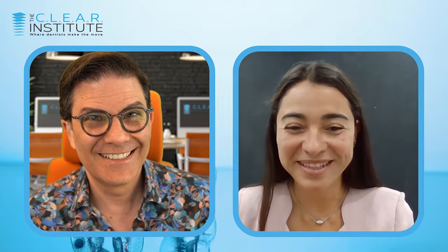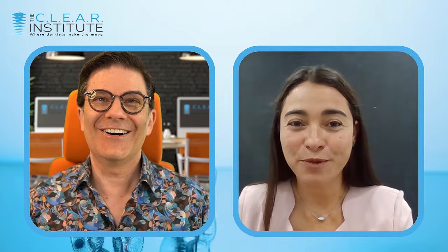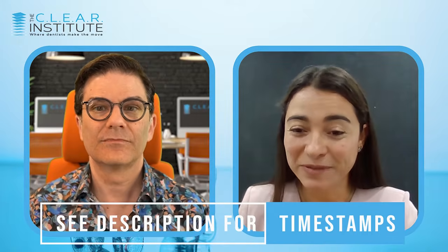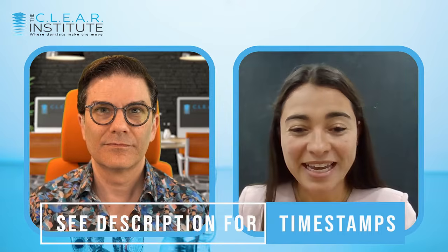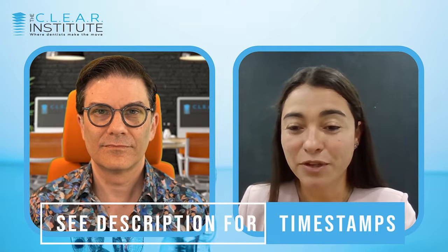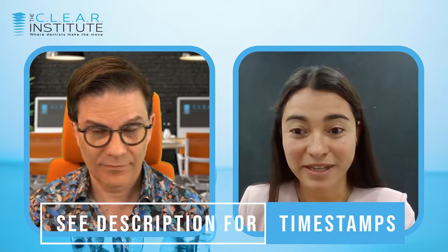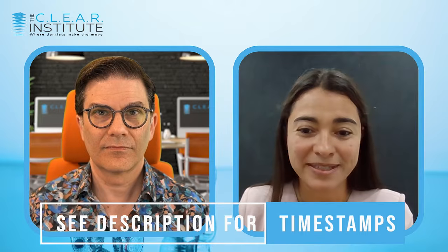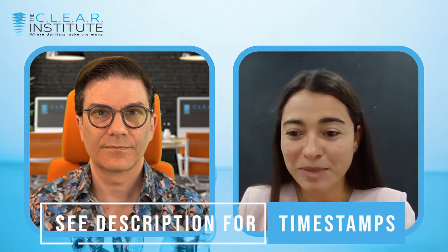Yeah, absolutely. So I'm going to go through your case with a little bit of the details of how the process works. Feel free to interrupt me. And as I always say, this is a great opportunity for learning lots of things, not only from this case, but from the whole clear aligner process. So let's jump into it.